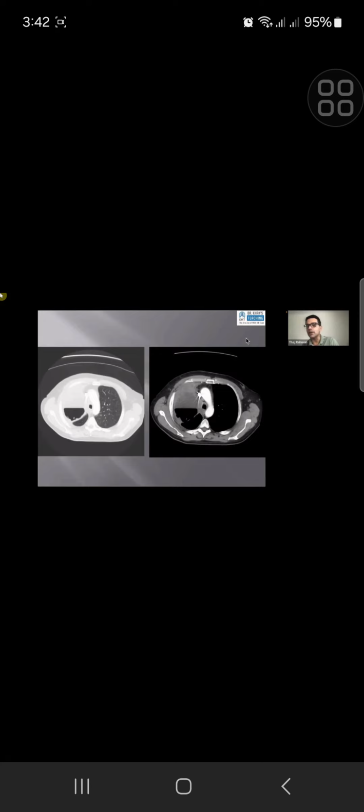You know, they may trick you. So the CT, if you look at the gantry, you can see the gantry here. So the patient is prone. The anterior chest wall is on the gantry. So look for the gantry all the time. They may trick you with prone and supine CTs. I use it in my daily practice even now. Sometimes odd things are seen. Oh, why is that like that?